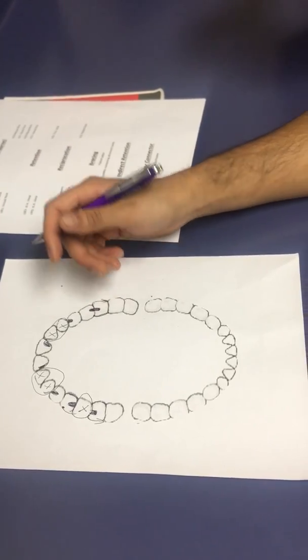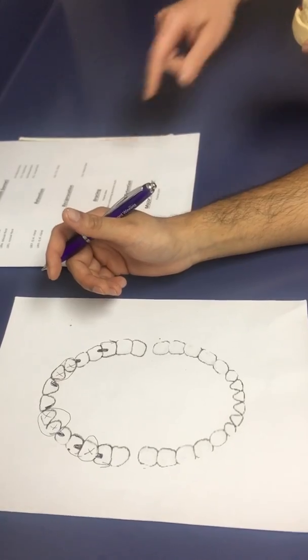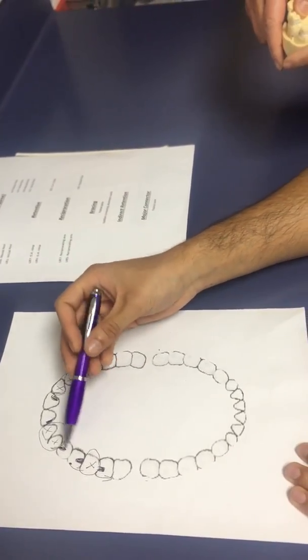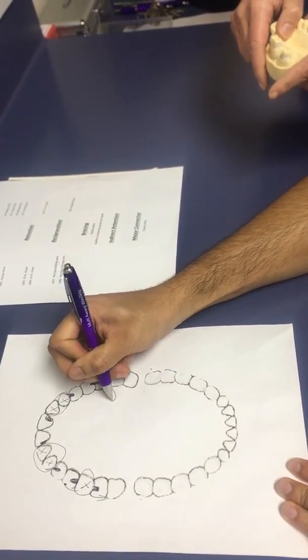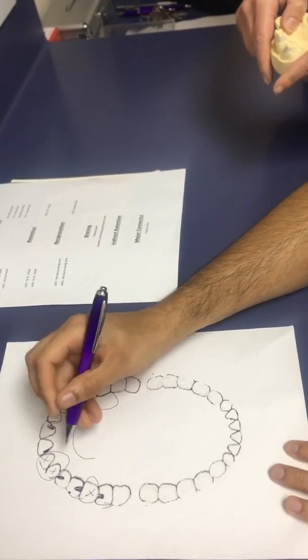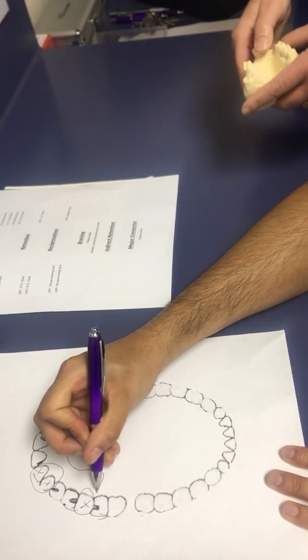Okay, perfect. And then after you've done reciprocation, what else are you thinking of? Bracing? So bracing, because it's a bounded saddle, you've got your abutment teeth, but also you've got the design for a plate. So if I draw a plate, I want it to go like a horseshoe shape. Why horseshoe? I don't want to cover the palate so it's easily cleansable. It's just easier to clean.